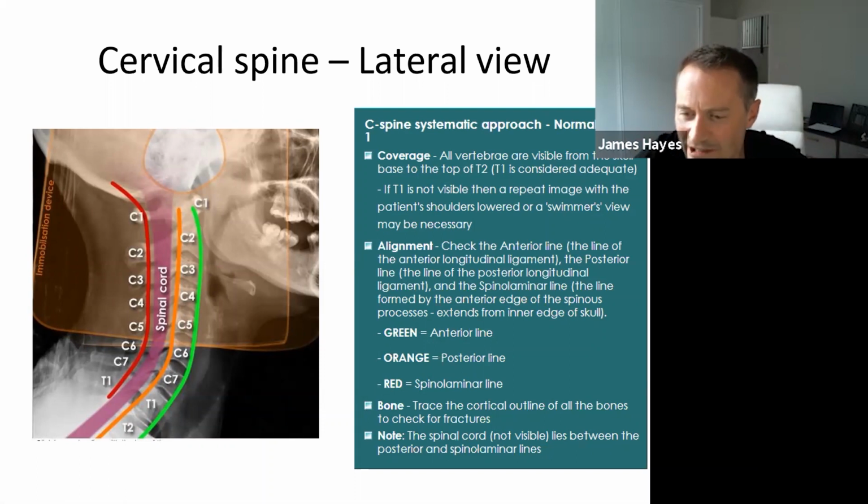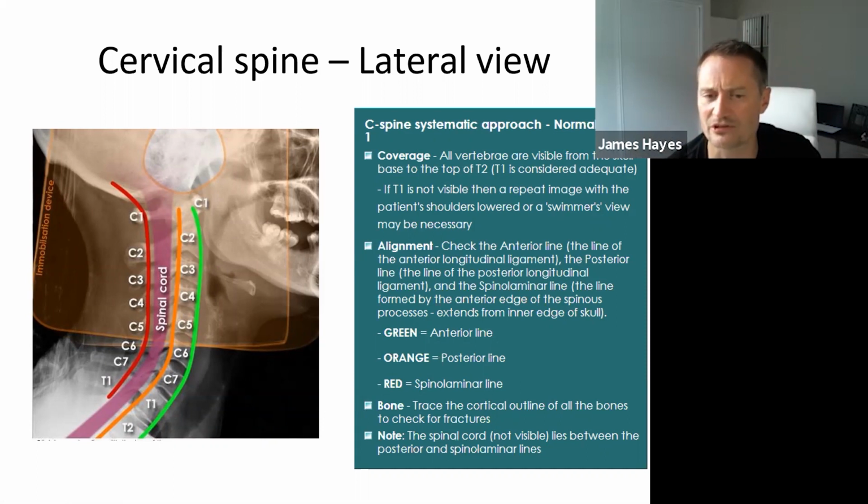Look, this is the last x-ray of the bone I'm going to show you, and I've only added this one of the neck because it's very important. There are lots of images of the spine that you'd look at if you were looking for a fracture, but this is something that you may see coming into the department. And if you can look at one cervical x-ray, this is the one to look at. So this one has a collar, so you know they've come in with a reasonable amount of trauma. You can count all the way down to T2, which is fantastic, okay?